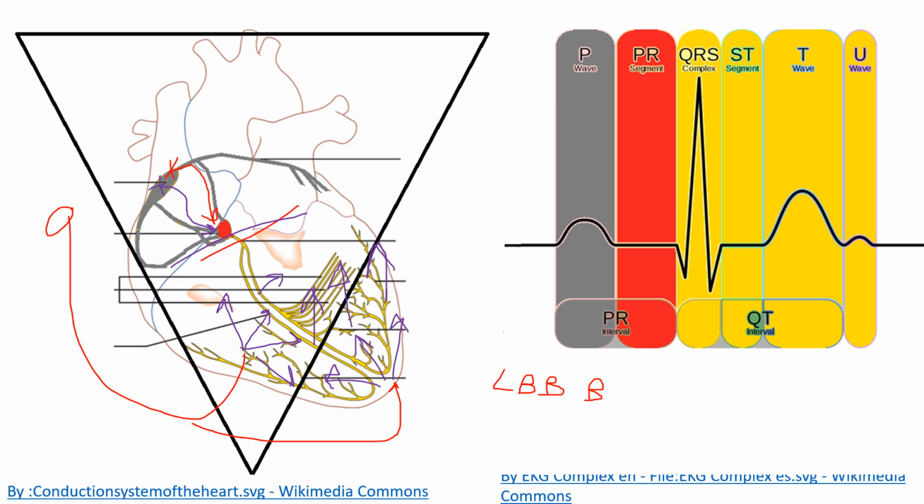And so the whole reason for this biventricular pacing is to get rid of this left bundle branch block like behavior. How do you know that you've got a pacemaker right here? Because you're going to see a pacer spike, this straight line going up here. Why? A lot of voltage, a lot of change in voltage over a very short time. So I'm just going to draw that line once again in white. A huge voltage change over a very short period of time, right?